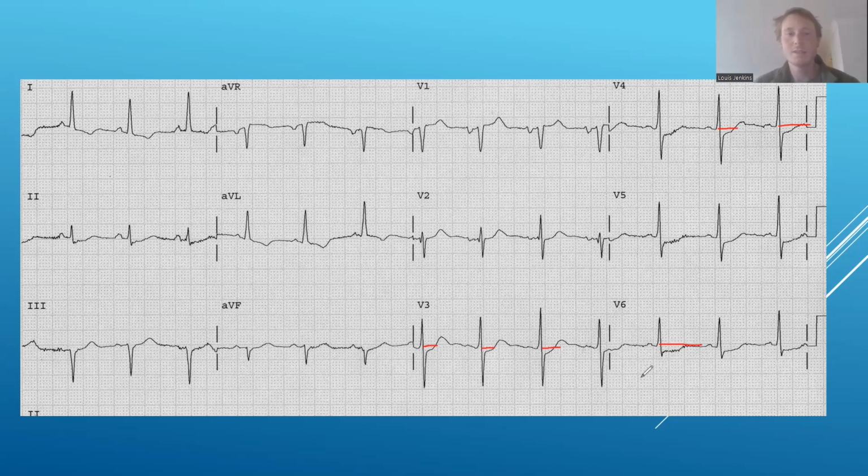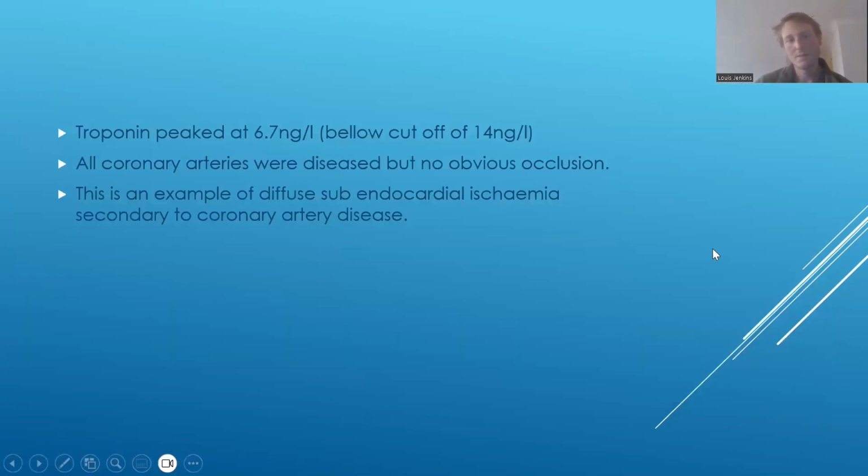So this is unusual. The patient is not meeting STEMI criteria. They're not meeting left bundle branch block or VPR criteria because it's neither of those. Are they meeting heart attack admission criteria? No, because this patient does not have chest pain. So despite these changes, this patient should go to the local hospital. But they were not. They were taken to an angiogram.